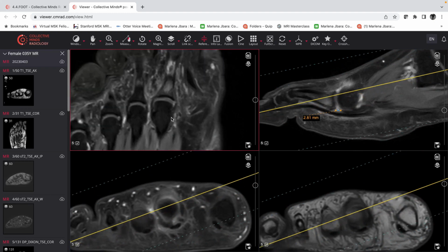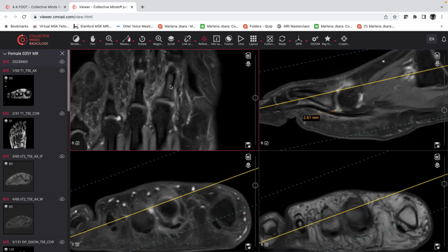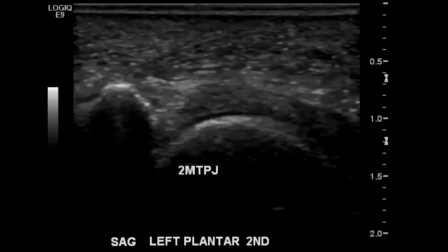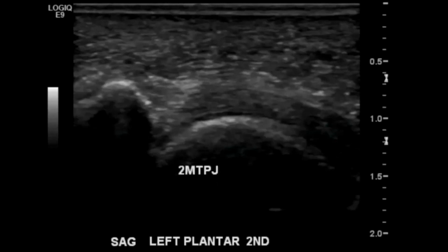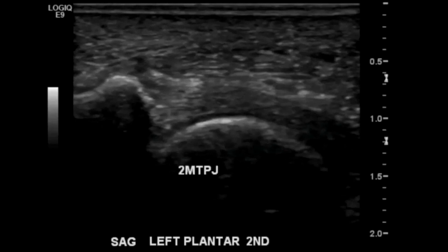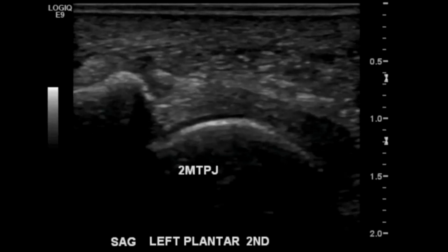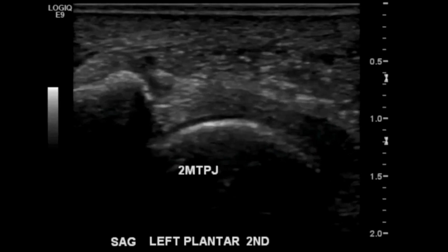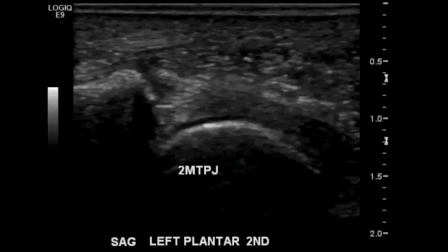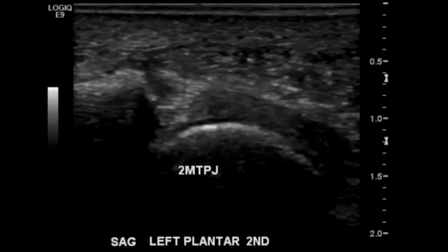And that is a second MTP plantar plate tear, partial tear, high grade with proximal phalangeal stress-related edema and pseudoneuroma. Plantar plate tears are an increasingly recognized cause of metatarsalgia, and ultrasound evaluation is very useful in the longitudinal plane. We found that lesser MTP joint plantar plate tears are most common at the second MTP joint, and they tend to involve the lateral distal plate insertion. They can tear transverse and longitudinally, and it's variable depending on the biomechanics.